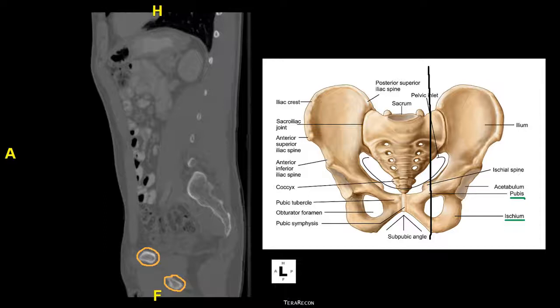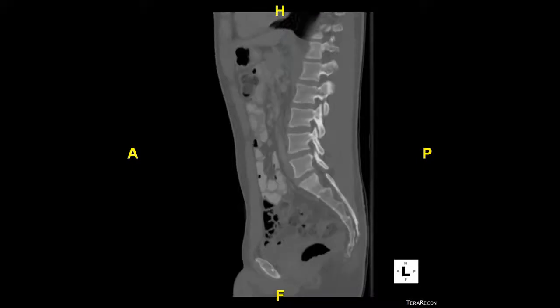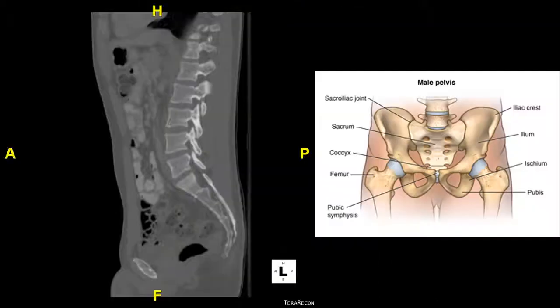If you are having trouble visualizing these on 2D images, I suggest you go down to the lab and view a 3D model of a pelvis to help orient yourself. The lumbar vertebra are starting to come into view in the next few slides. We haven't reached the vertebral canal, but since we can see parts of the lumbar vertebra, we are very close. Let's orient ourselves again. And I'll draw a line here showing that we're not medial enough to have entered the vertebral canal.